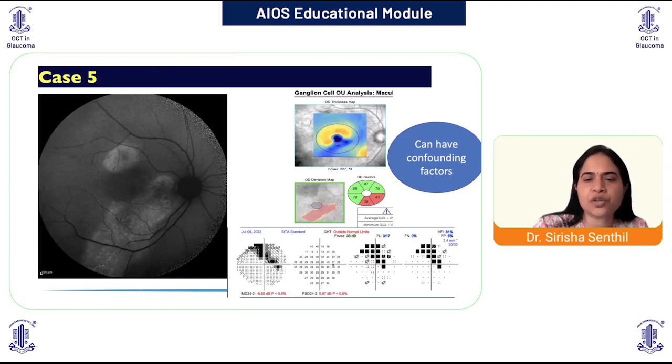So whenever you have a strong suspicion, another lesson that we learn is you have to go back and either check it with your retinal specialist, otherwise ask for an autofluorescence, and that shows you the photoreceptor, RPE changes that are present. Or you can also do a macular OCT or an OCT in the inferior area as well, if it is possible.